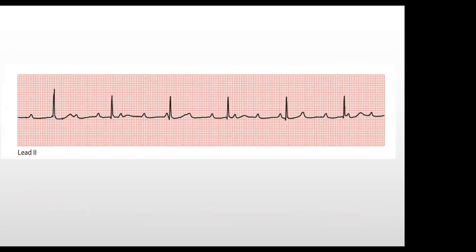So what do you think about this ECG? Who is there? I would suggest that whenever you see an ECG, either you raise your hand or unmute your mic and start talking, because on the exam day you will have to talk by default. So if I were you, I would rehearse before the exam day.